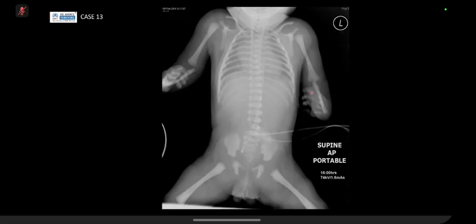For this radiograph, I don't see any gas bubble, any gas shadow in the abdomen. Also I see there is some linear tubular structure in the upper part of the esophagus. So I am going with esophageal atresia, complete esophageal atresia without fistula. Okay.